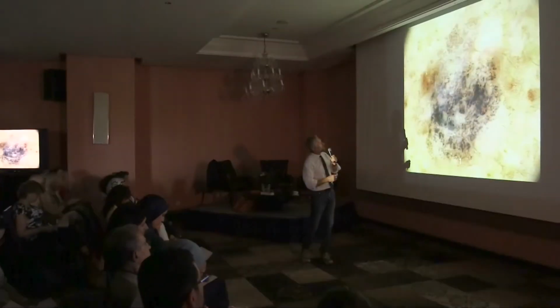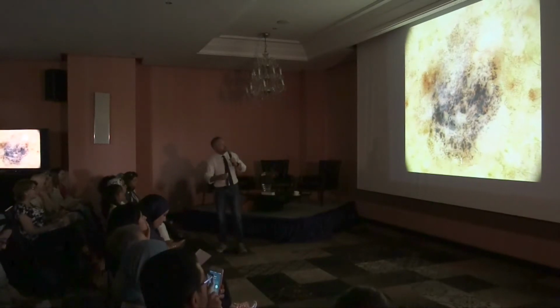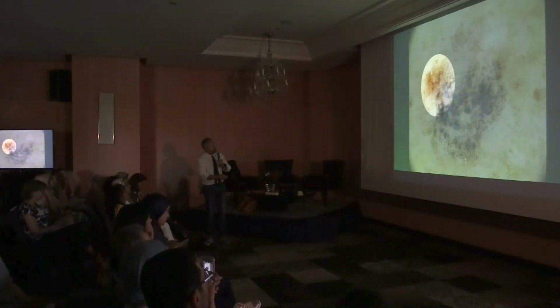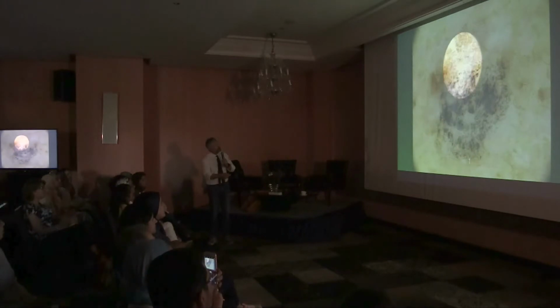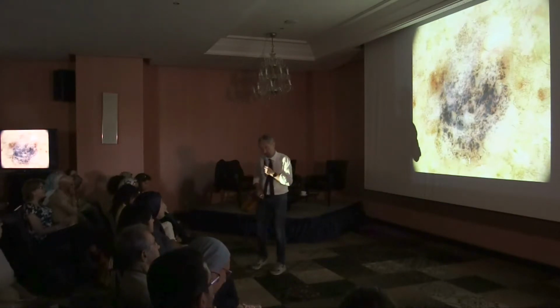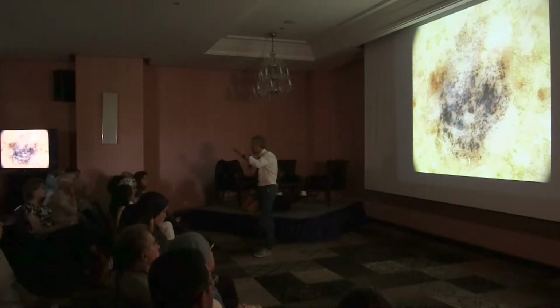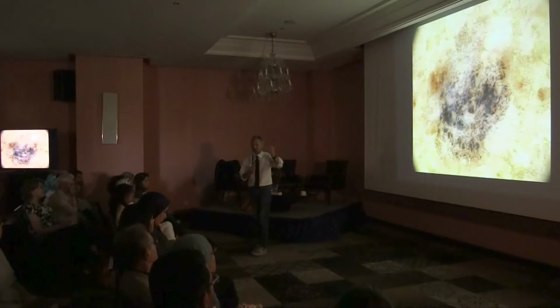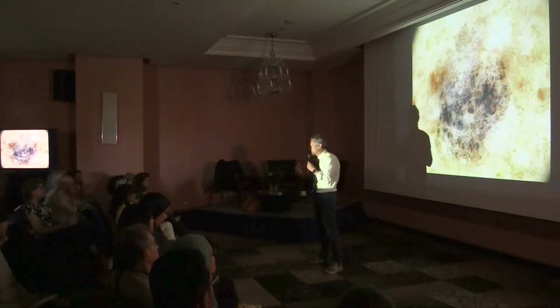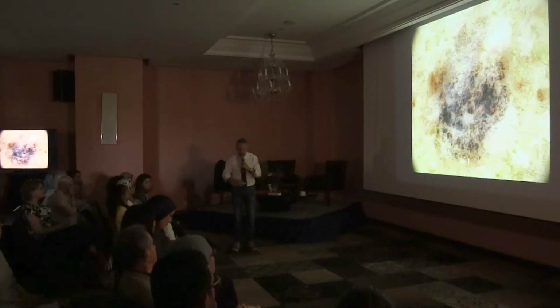So let's start from the beginning. Number 1. What do you think about number 1? Collision. So what could it be? Lentigo solare? So is it a lesion we have to remove or not? Remove. Okay. Why? One possibility is a benign lesion, for example, lichenoid keratosis, right? Another possibility is melanoma, of course, regressive. So in my view, it's a lesion we should remove. I will tell you in a minute what it was.